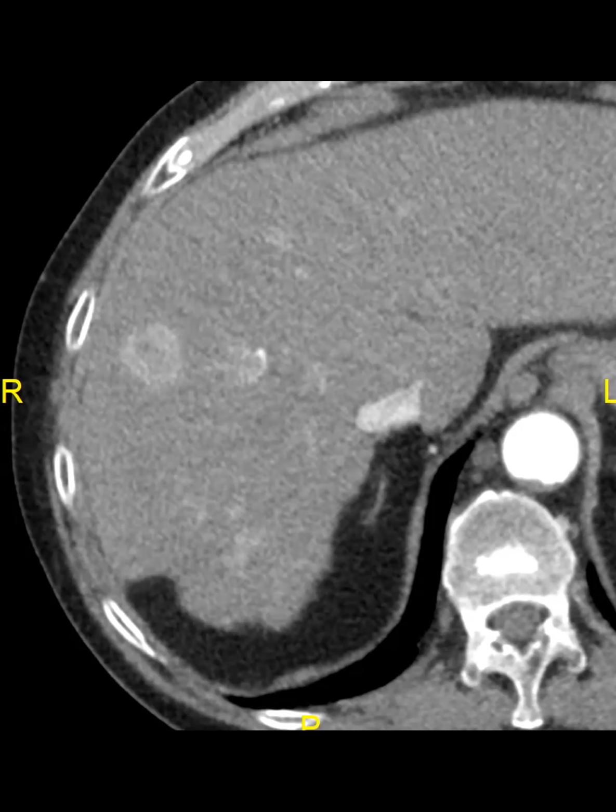Targetoid always trumps non-targetoid. Again, because we want to really preserve the specificity of LR-5 for HCC. So it's not an error. Let's say if this came back as HCC, it's not an error, and it's not a failure of LI-RADS. It's fine. A third of LR-M observations are HCCs. So that's okay. But if we called this LR-5 and it ended up being a combined tumor, that's considered to be an error.